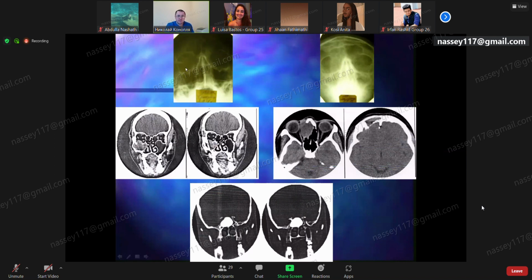In Russia, it's obligatory to do a medical examination, and this examination includes an X-ray of the paranasal sinuses. This patient had no problems, but on X-ray, there was this bony tumor, osteoma. Here you can see a big tumor, which involves the orbit, nasal cavity, maxillary sinus. Now, this is a big tumor.